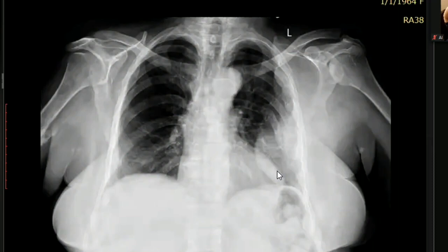So I think this is an aggressive, neoplastic process, and the breast shadows are visible. There is no evidence of mastectomy, and there is a lytic lesion in the humerus. Keeping in mind these lytic lesions, I would like to review the right humerus as well. Maybe there is some pathological fracture with a healing process.